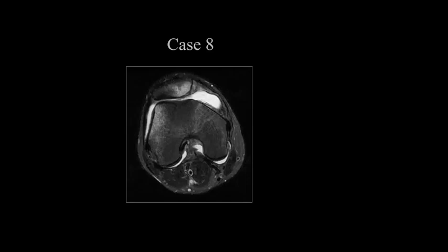Axial MR at the level of the knee joint, FATSAT T2, showing abnormal signal intensity involving the medial aspect of the patella and lateral aspect of the femur, suggesting patellar dislocation, and the patella has reduced to its normal place.